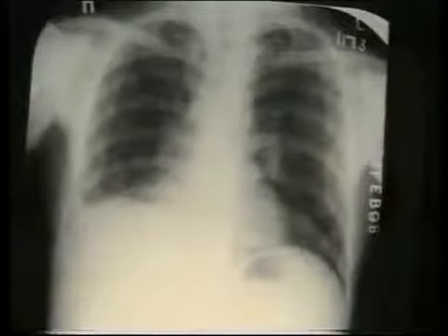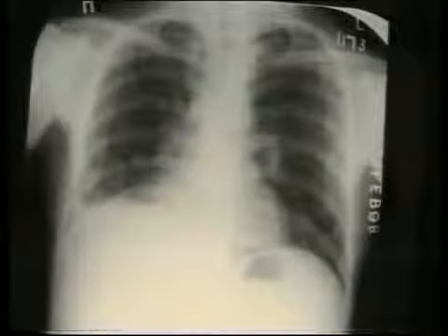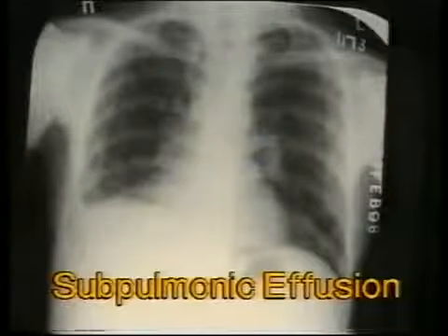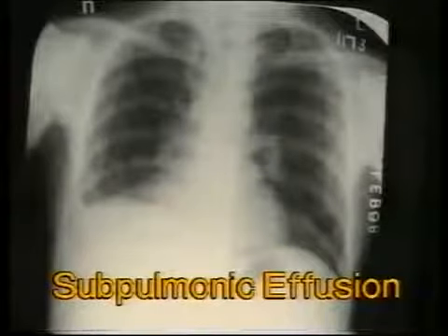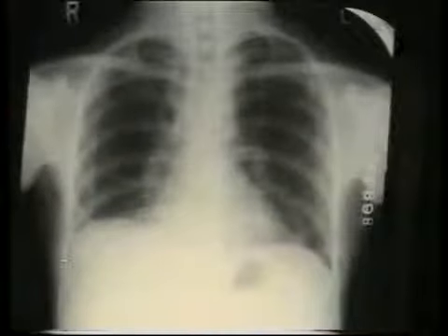Sometimes the fluid gets collected under the lower surface of the lung, between the lung and the diaphragm, and remains convex upwards. Note in this X-ray that the right diaphragm appears to be elevated with preservation of the costophrenic angle. This is termed a subpulmonic effusion, an effusion under the lung. After aspiration of fluid, the true diaphragm is seen and the lower lobe of the lung has expanded.